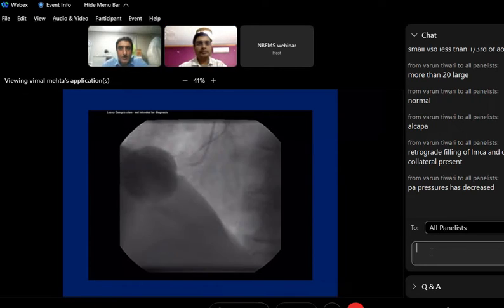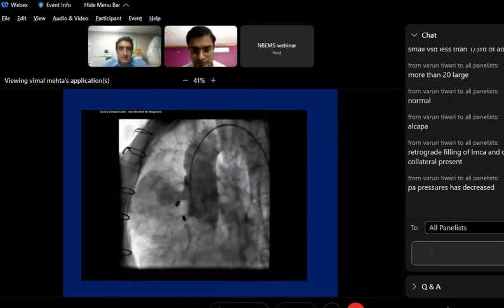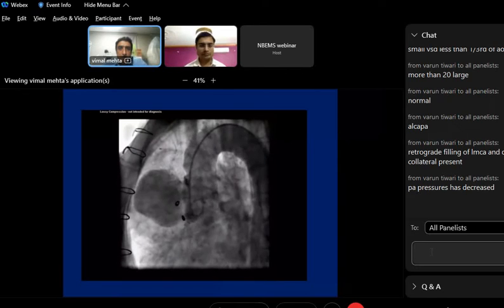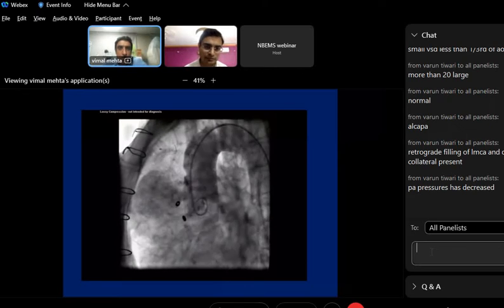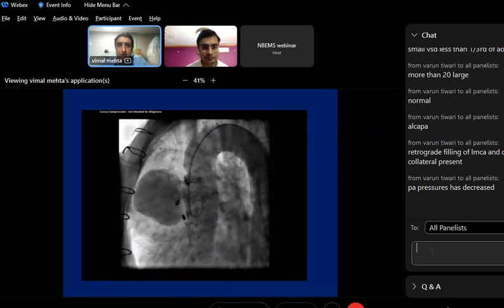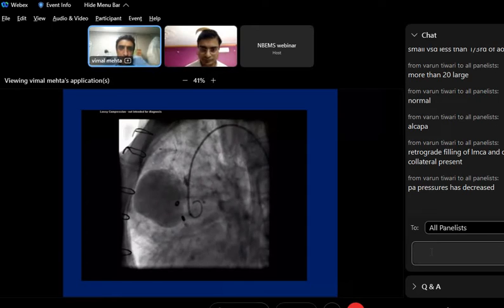So, okay. Just describe what you see quickly. Don't waste time. Quickly describe what you see.